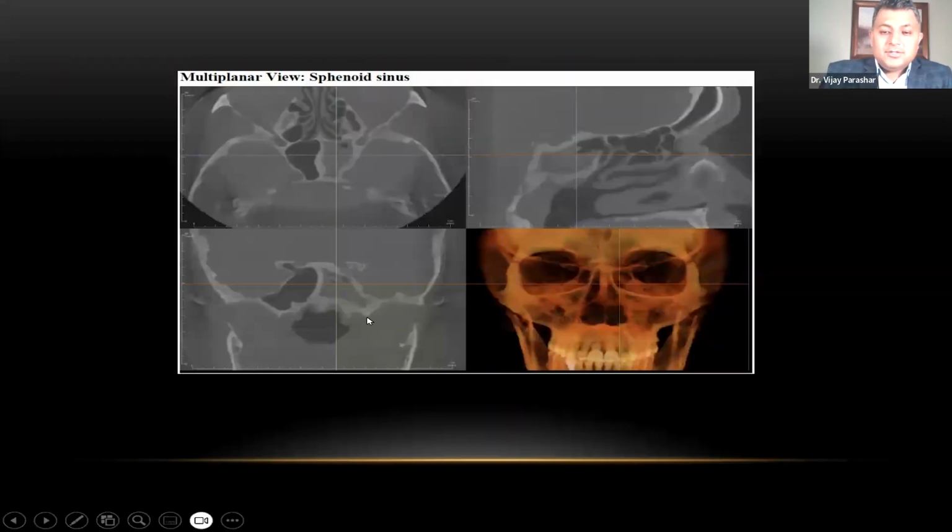All right, in addition to maxillary sinusitis, so we saw right maxillary sinus, left maxillary sinus. In addition, because when you're looking at airways, you also capture the sphenoid sinus, which is this sinus up here. Another image, another image. So let's look at the right sphenoidal sinus on this scan, which looks clear or patent. It should look empty. It should be air-filled. That is what sinuses are supposed to look like, which is this one.